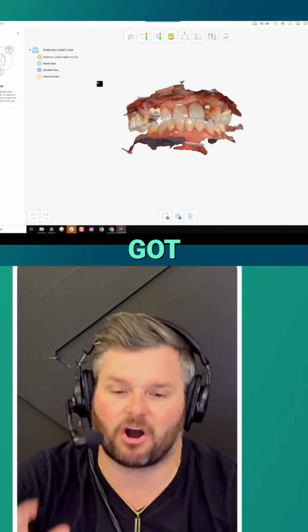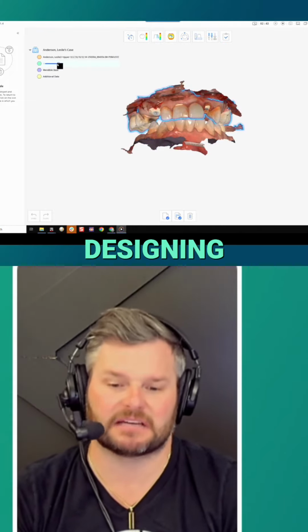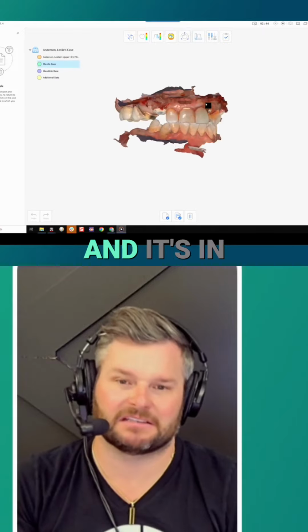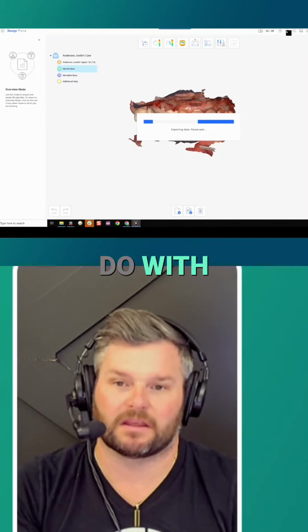So now I've got all my data meshed. This gets sent to the lab, and they can immediately start designing. This video is less than 3 minutes, and it's in real time. That kind of tells you the extent of what we can do with Medit Design.